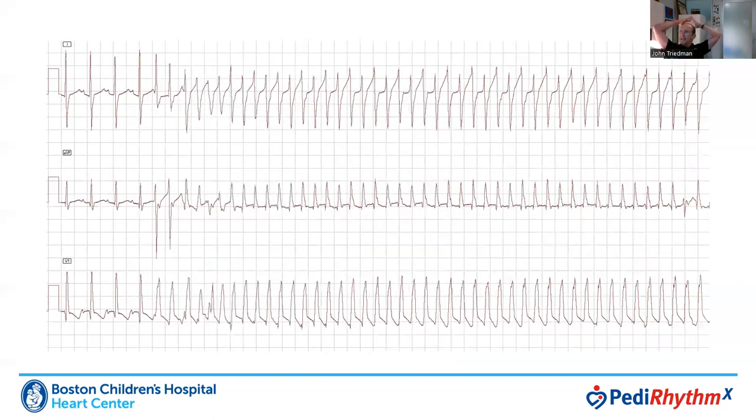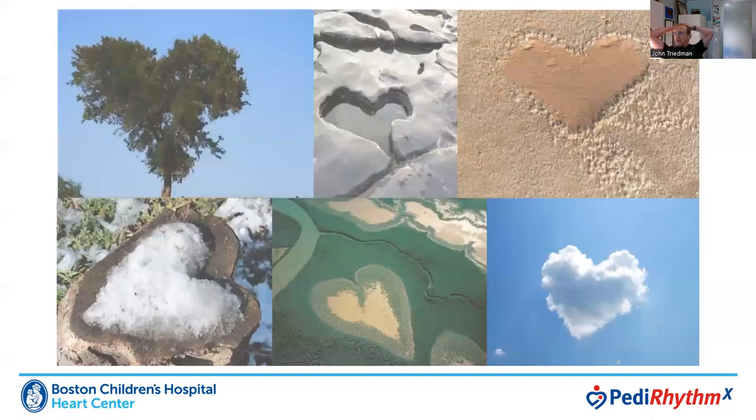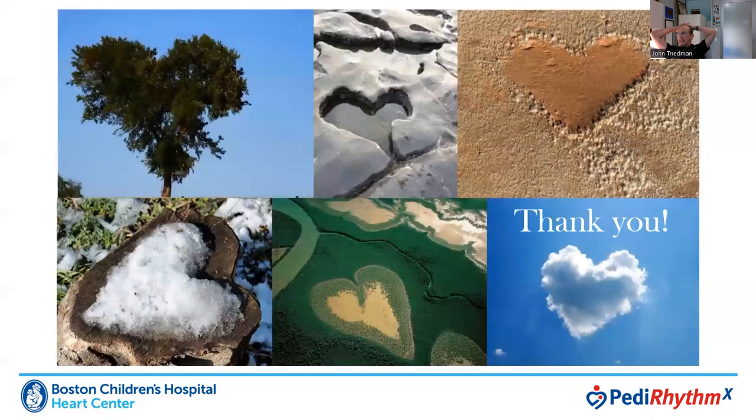I'm going to end with this thought, actually. I'd like to thank you for your attention. I hope you realize that there's a lot that we can get out of the electrocardiogram simply by looking at its standard features, looking at various gifts that were given by circumstance, by counting up the A's and V's, and by not losing your head when you're confronted with a puzzling tracing.